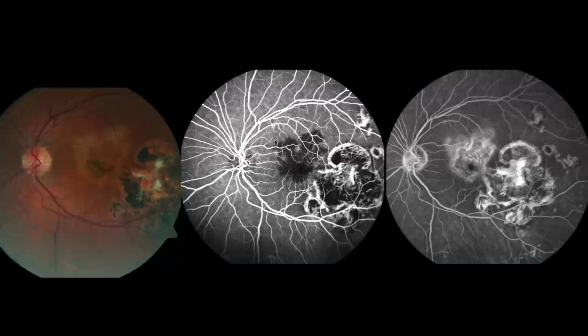So this is the first lesion. And then nagiging ganyan. Then this is the second lesion. It's this one. And it becomes like this. Yes. Parang early blockage with late staining. Okay. And then the second lesion, parang mas staining, staining lang. So which of the two is the active lesion? The one with early blockage and late staining.